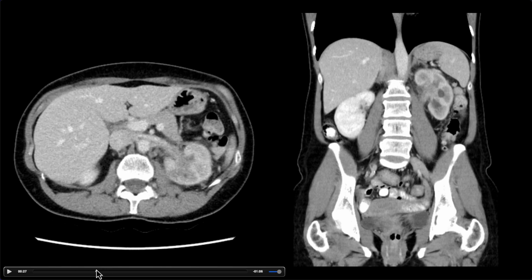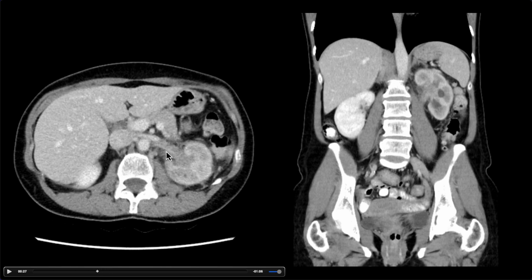And so what's our differential? Well, one of the important items to add to your differential, when maybe you think at first it looks like infection, but it's not infection, is to consider tumor. And this indeed is an infiltrative type of tumor.